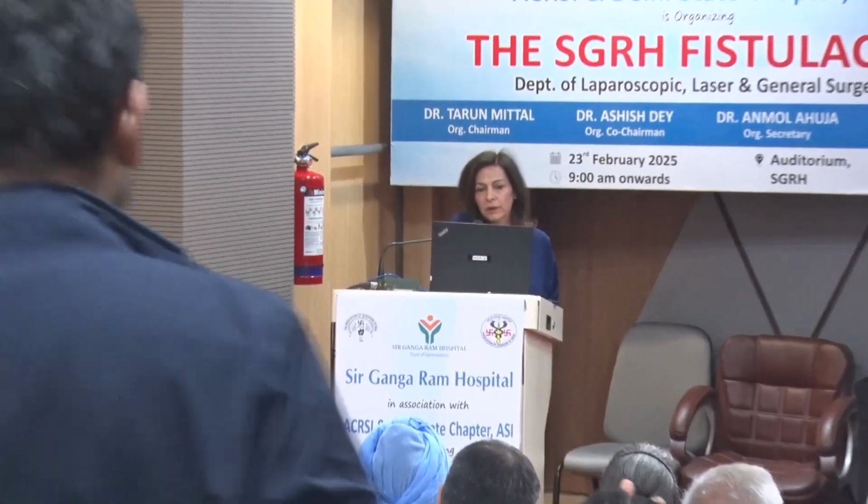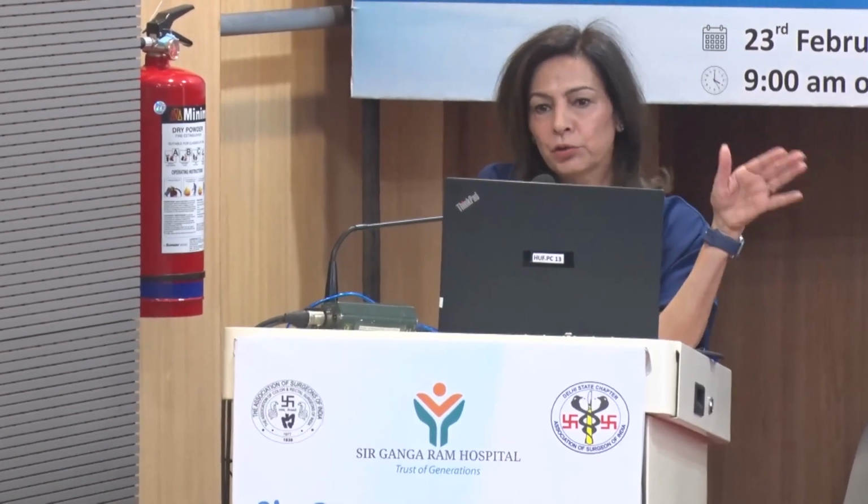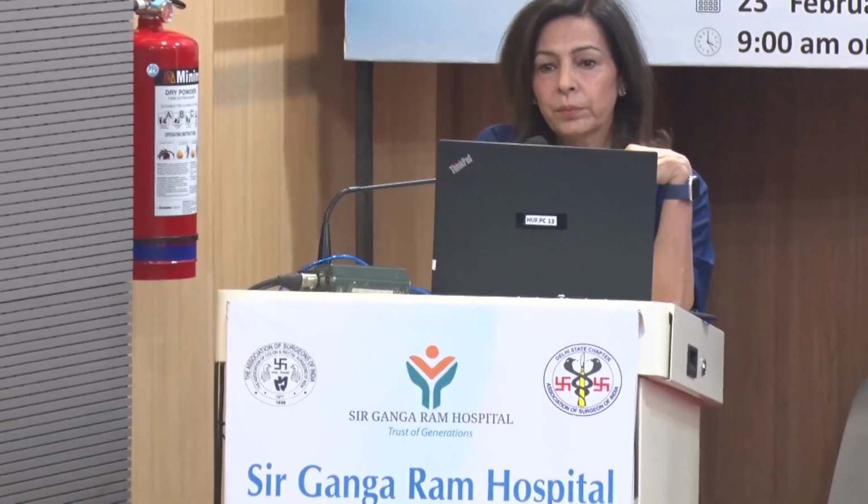Ma'am, does transrectal ultrasonography have any role in fistula diagnosis? So yes, transrectal sonography is there, but I told you again, the field of view is small and you will not be able to look at the supralevator areas. It's painful. You're inserting a probe inside. And the easiest way to delineate is MR, because there's no intervention. But yes, for the internal opening, the accuracy is higher for a transrectal ultrasound vis-a-vis this, but the surrounding anatomy, the surrounding information is not there.